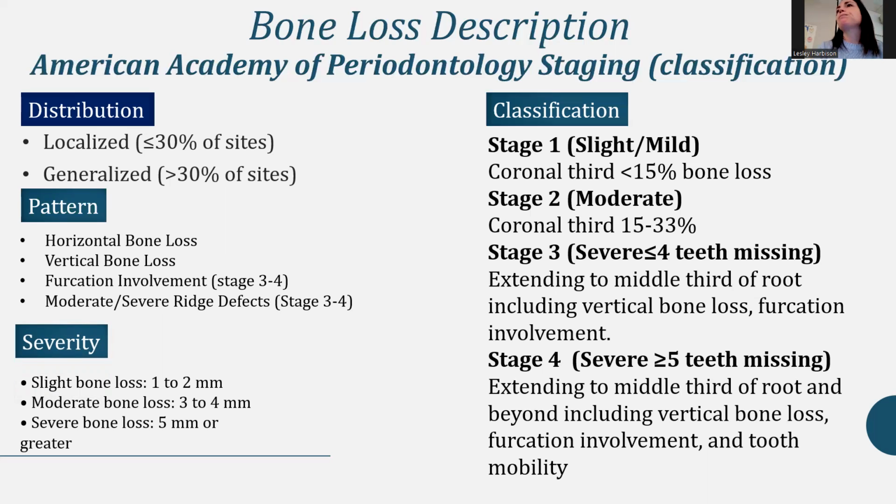Does any of this take into account how deep focus are we? Yes, it does, because when you do periodontal charting, you're measuring from the top of the gingiva to the bottom of the sulcus or the bottom of the periodontal pocket. So there are different numbers that you'll learn. It does relate to the periodontal pocket, but you also have to think about it in terms of clinical attachment loss, because you may have a really swollen pocket that makes your pocket deep, even though the actual bone loss isn't that bad.